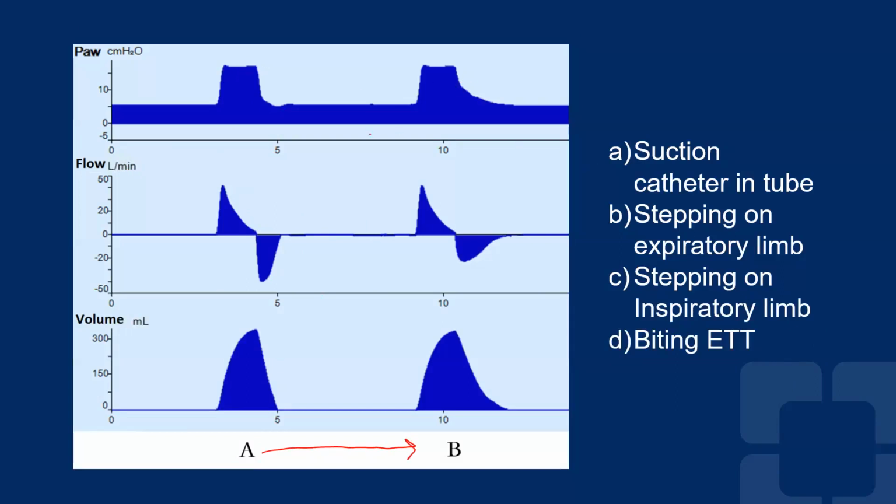Again, this is just to demonstrate in these cases how the pressure would normally drop rapidly from the ventilator. And even if the resistance was increased, the ventilator would still drop the pressure rapidly to baseline. The changes that you see when you're controlling the pressure during expiration are in the flow, not in the pressure waveform. So any of these in which there was an increase of resistance should not affect your pressure waveform. They should affect it if you're controlling the expiratory flow.